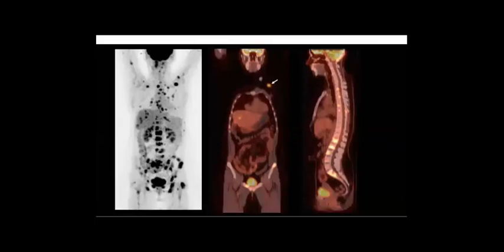This, in daily practice of PET-CT, you can see it in many patients. Osseous vertebral lesions with very high uptake. And maybe you can see the metastasis everywhere: in the spine, the bones, liver, lung, lymphadenopathy.